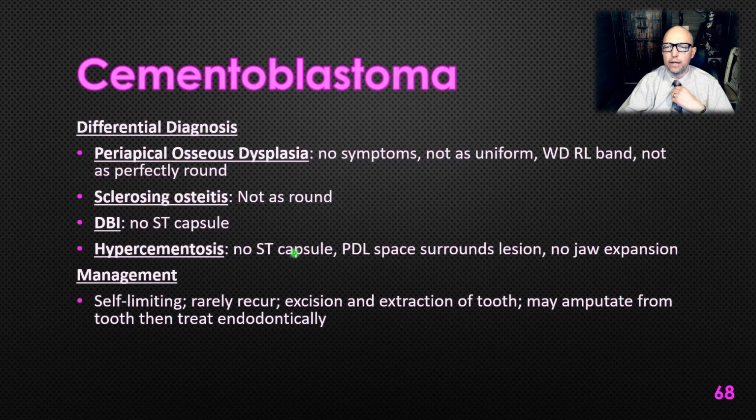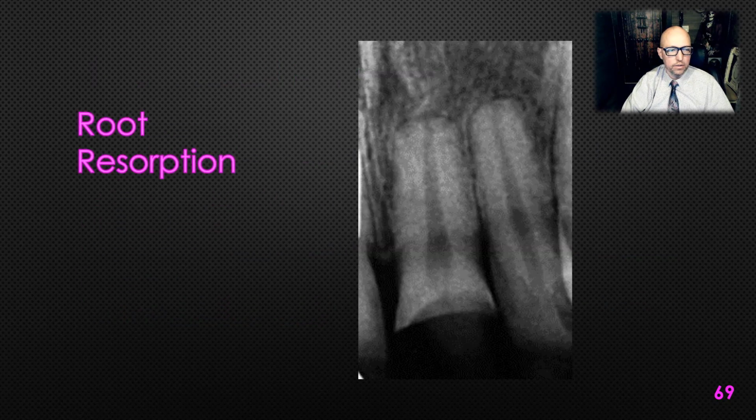Hypercementosis, what did we say about that? Look at that PDL space to remain uniform and intact around it. All right, these are self-limiting, but they can be painful. So probably if you see a cementoblastoma, it's going to need to be excised and biopsied to verify your differential diagnosis.